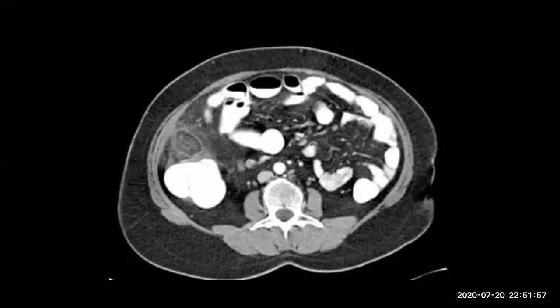How do we differentiate epiploic appendagitis from omental infarction? In addition to the site of the lesion, location is number one. Okay, the size. What is the size? The size of the lesion, or absence of the hyperdense ring.